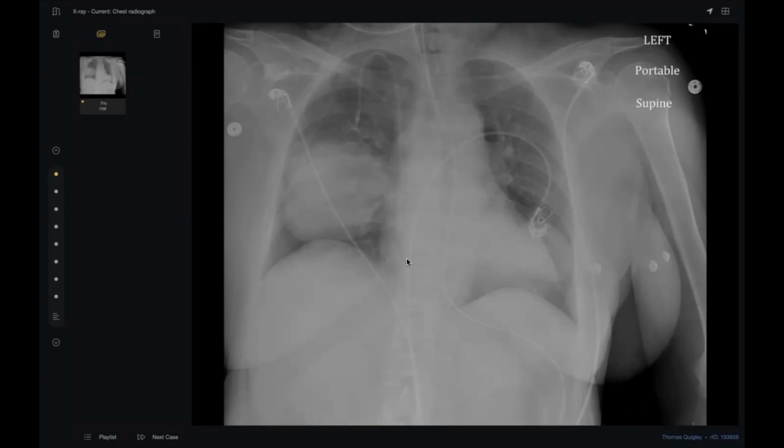It could be infection, pneumonia, it could be a neoplastic process, lung cancer. What is this? This is a portacath. So he is an oncology patient, and this is most likely a lung mass. First comment on the lines. Where is the portacath here? Is this the correct position?